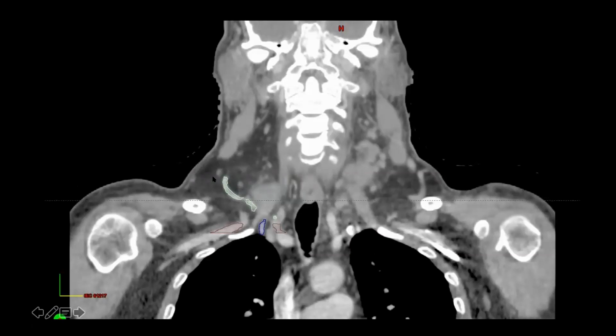If you put your border over here at the cricoid, approximately, this will mean you are putting the lower border of 5A. This is your lower border of 5B, and 2 centimeters from the manubrium sternum, somewhere around here, will be your lower border of 5C.